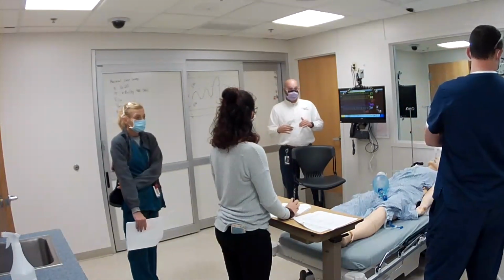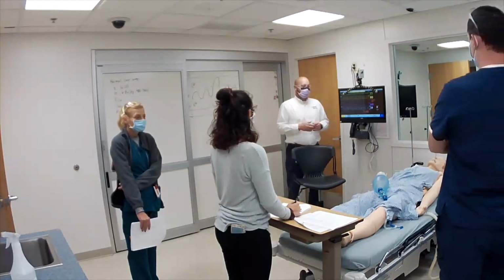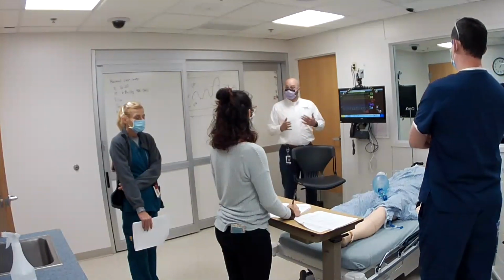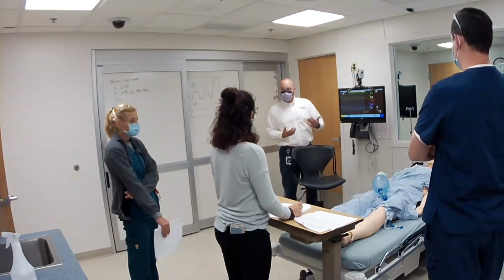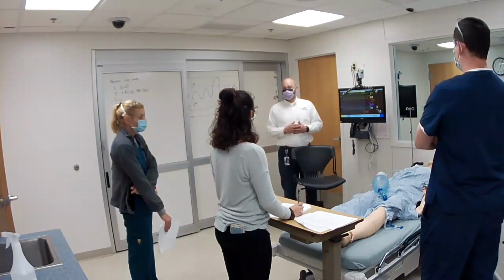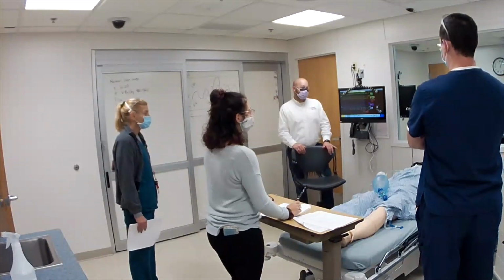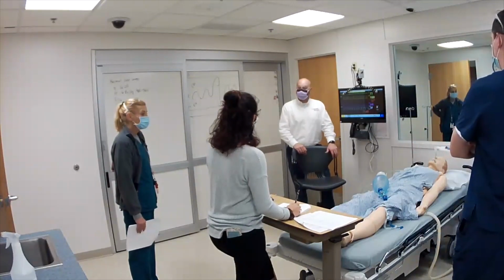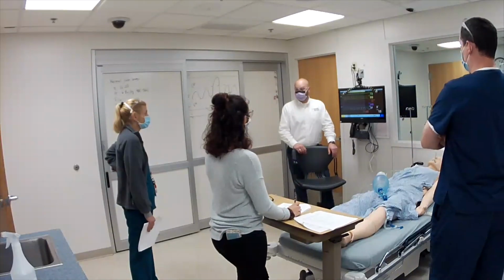Is the patient getting better or worse? If our vent settings haven't really changed much, are they getting better or worse? That's a great way to chart that day in and day out. But I love using it to tweak my vent numbers too. If I'm making changes on the vent, I watch those compliance numbers, see if they're getting better or not. That lets me dial in exactly where I want to be.